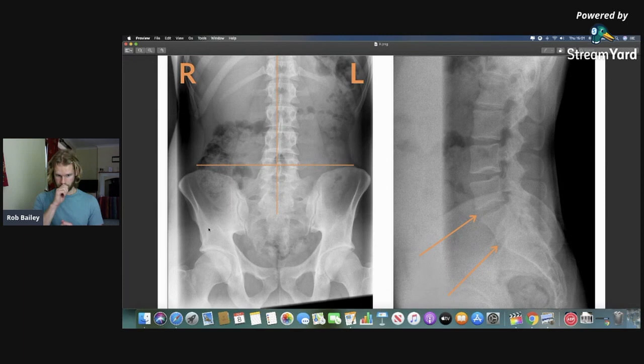Now if I lay on my front and you check the length of my legs, my right leg is always a little bit shorter. So it's likely that on the right side I do actually have a difference in leg length. So when I'm standing here without any shoes on, and it drops down, that's why you get that gap there. Okay, the hips, there's probably arguably a little bit of degeneration in the hips, not dreadful, maybe a little bit of wear, nothing drastic if you like.